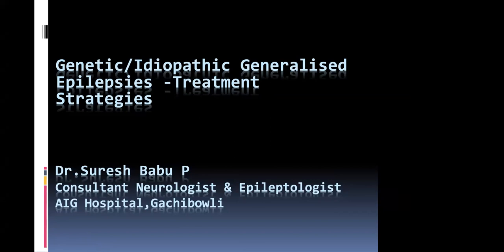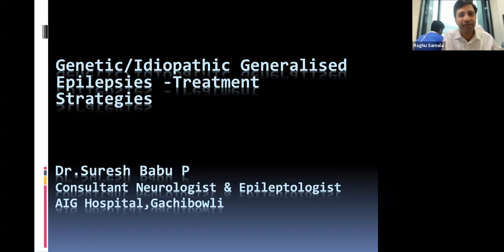See, I thought covering everything in one go is difficult. So I will divide the topic into genetic epilepsies and focal epilepsies. Today I will speak about the genetic generalized epilepsies. I have a few videos of the generalized epilepsies, and I will show those.